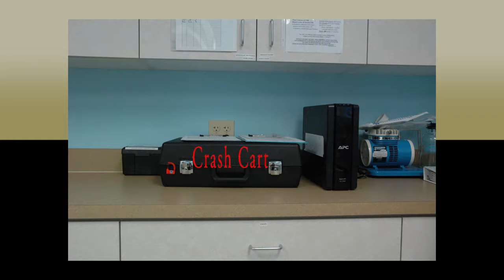Along with the crash cart is the AED, or automatic defibrillator, and is used in case of cardiac arrest or ventricular fibrillation. Again, the use of this equipment will be directed by the physicians. It is important, however, you know where it's located and what it is called.